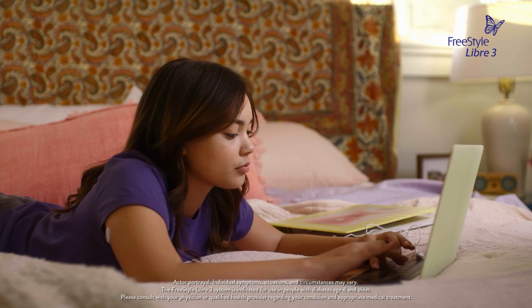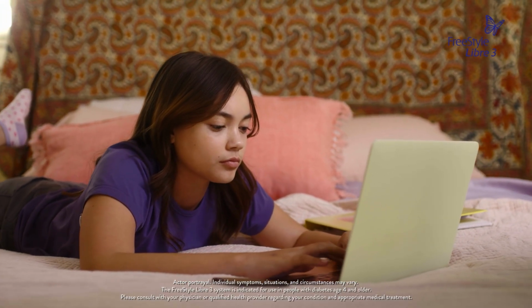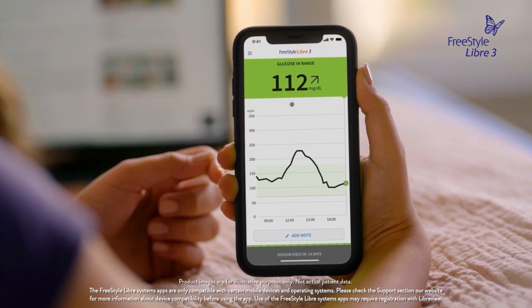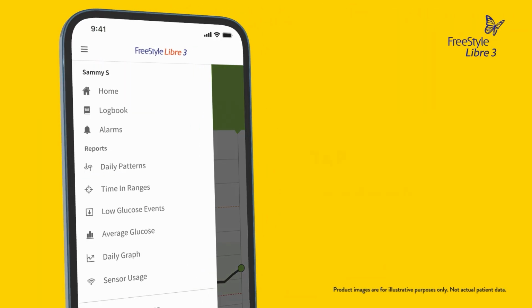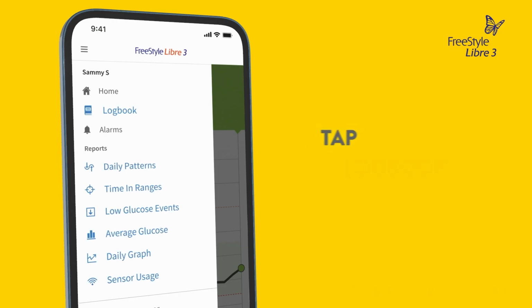The FreeStyle Libre 3 app sends glucose data to my phone every minute and creates detailed reports I can see right in the app, which I use to better understand my glucose trends and patterns. You can access reports from the app home screen. From the main menu, tap Logbook, or tap on one of the other history options under Reports.